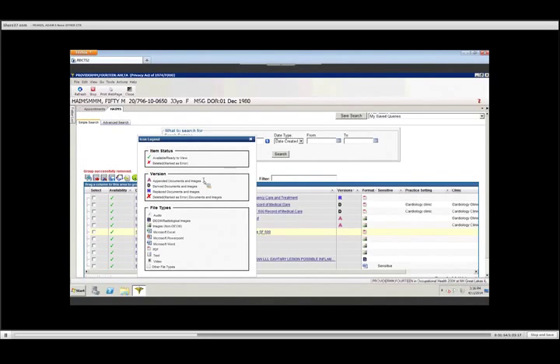Down below that, we see file types. We have audio files. This gray looking, looks like a X-ray, a chest X-ray. That stands for the DICOM, or the radiographical images. Of course, the two mountains with the sun looks like images. You've got all of your Microsoft products, your Excel, PowerPoint, Word, PDFs, text files, video files. Again, as I mentioned in the slide presentation, there's almost nothing that you cannot upload into the HAIMS system. And when we import a document, I will go into further detail on that. So that's your icon legend.